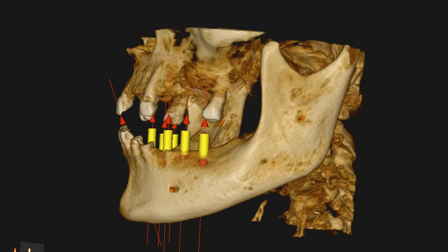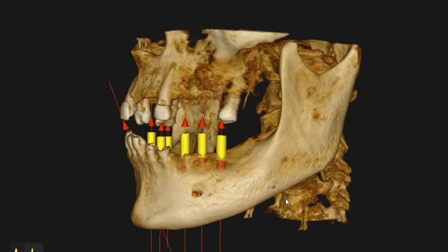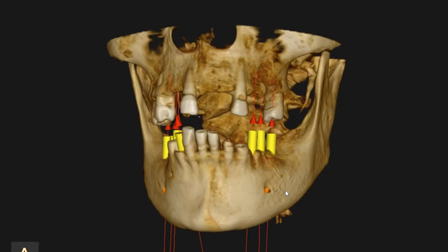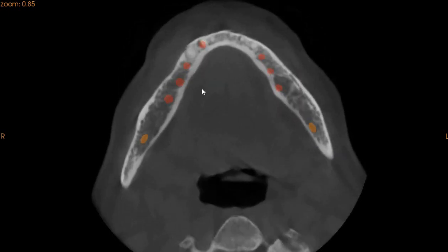The lower left has thinner bone as compared to the lower right. So hence that should be kept in mind. We've placed in the narrowest 3.9 mm of diameter, but if 3.3 mm diameter mini Megagen implants are available, you can attempt placing those more comfortably as well. This is how the X-ray looks on the axial view, which is the top to bottom view.